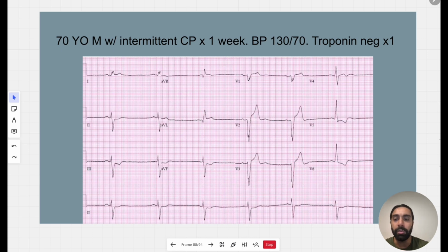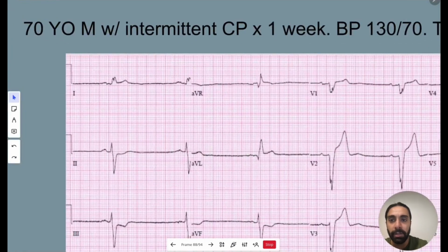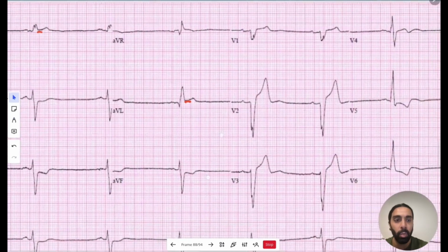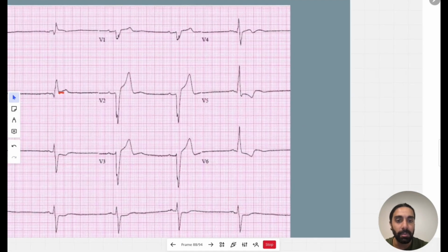Go ahead and review this one. This patient has a pretty pronounced bradycardia. There is a positive P wave in lead 2. And we see these bunny ears in lead 1, like a prolonged QRS, and probably ST elevation in aVL, and slight ST elevation in 1, with that same scooped appearance of the ST segment as we saw before.